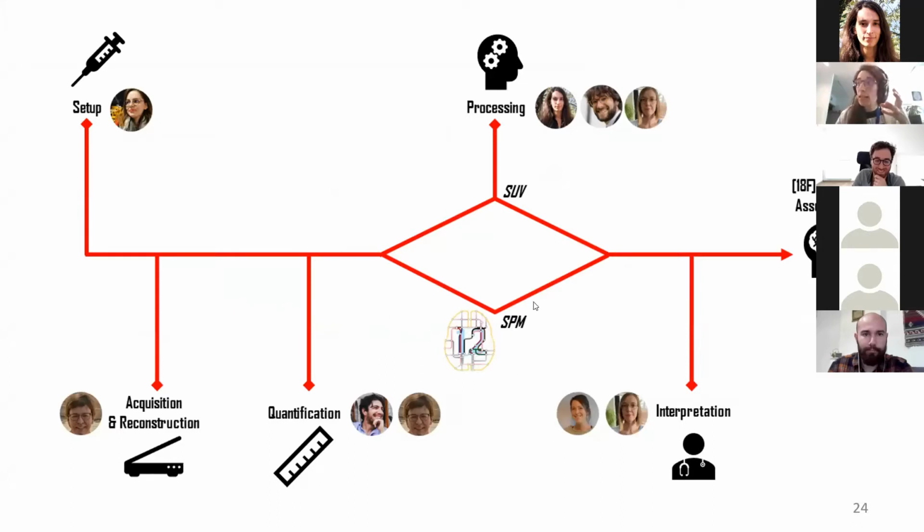And the second one is to use SPM to do a voxel-wise analysis and look at areas of hypometabolism or relatively preserved regions within the brain. So localizing the areas that suffer the most damage or the areas that are most preserved.